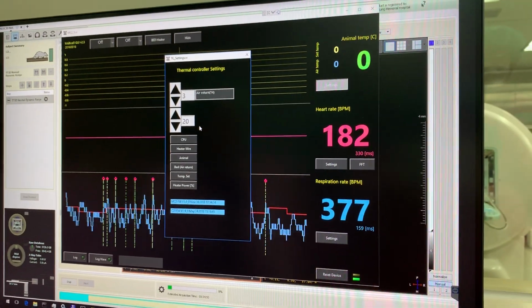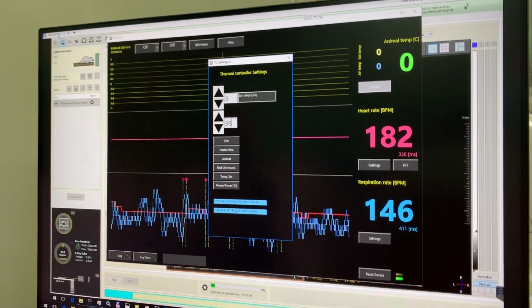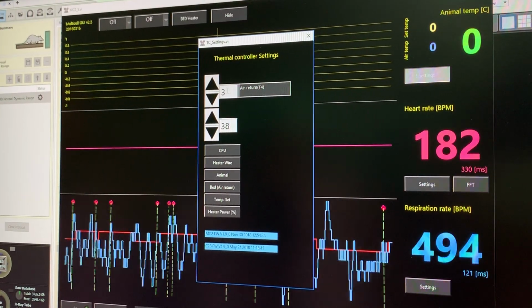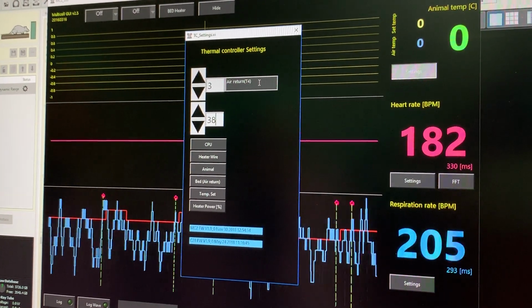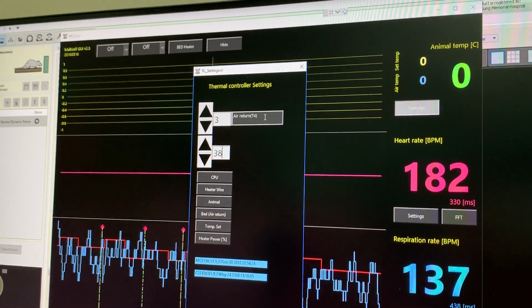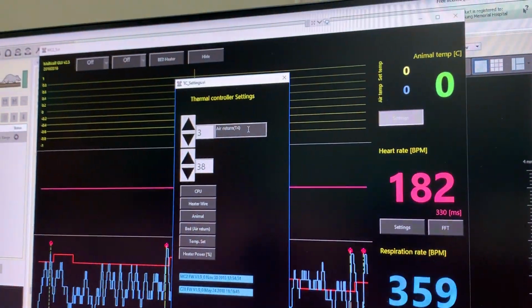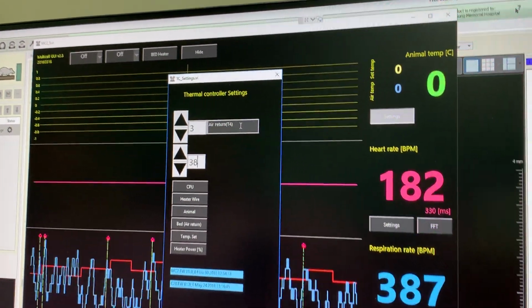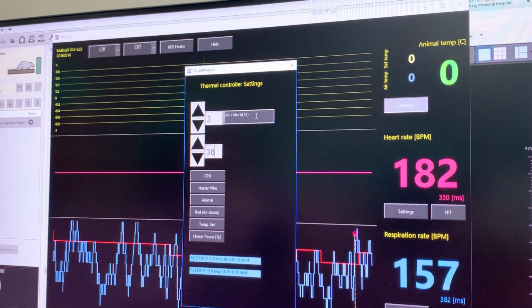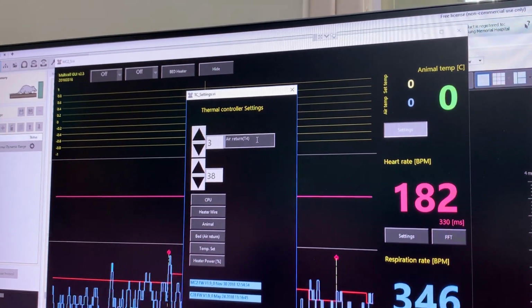Okay, so it's too low. First you have to set at least 38. And the 3 here shows us that the returning air temperature will be measured. The bed heating system works in a way that the pumped air will be heated in the docking unit, and that warm air will be convected at the bottom of the bed, and it is returning, and that returning air temperature will be measured by the docking unit again.